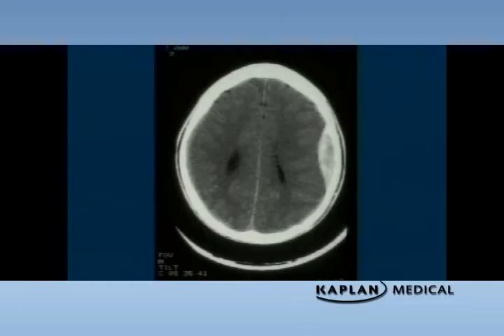Well, look at this. It's a CAT scan without contrast. Gee, I don't know a corpus callosum from a corpus cavernosum. I can't tell, but I'll tell you what, I don't have that thing on the other side. So this must be abnormal, because I only got one of them. So this is an epidural hematoma. Why epidural? Because it's pushing in the brain.